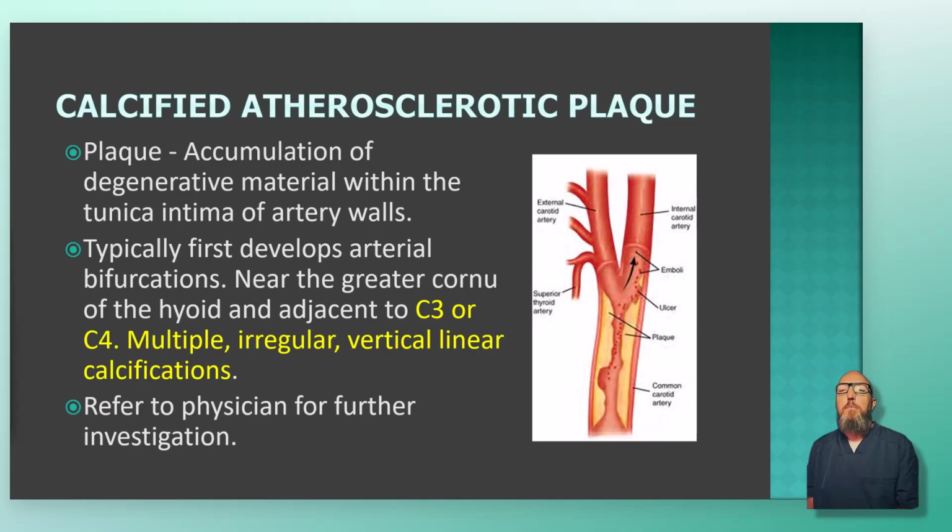And so I said this is important. The action you need to take is refer to a physician for further investigation. And I want to be clear about why. There's plenty of case reports of patients with calcified carotid atheromas on panoramic images who turned out to have clinically significant stenosis and elevated risk of stroke.